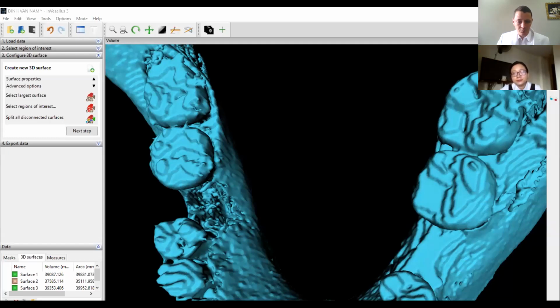So I will show you why with, in fact, the 3D file I did with a hard case.